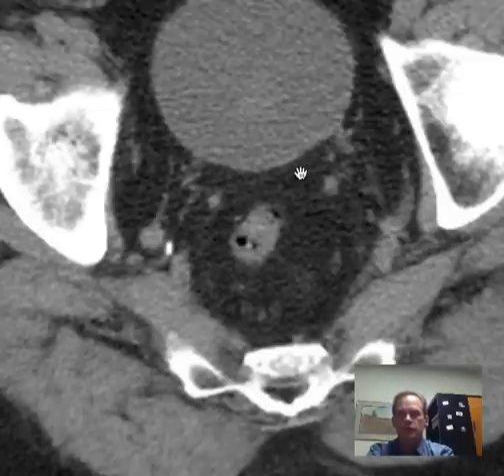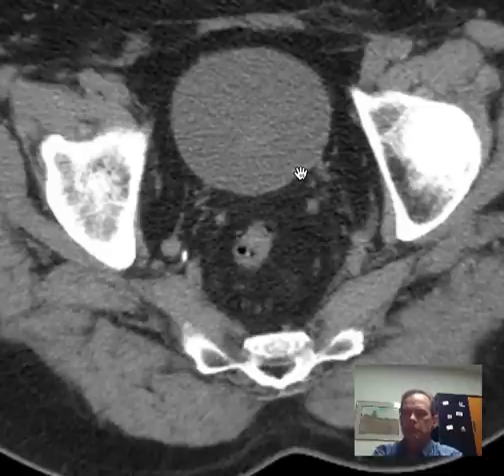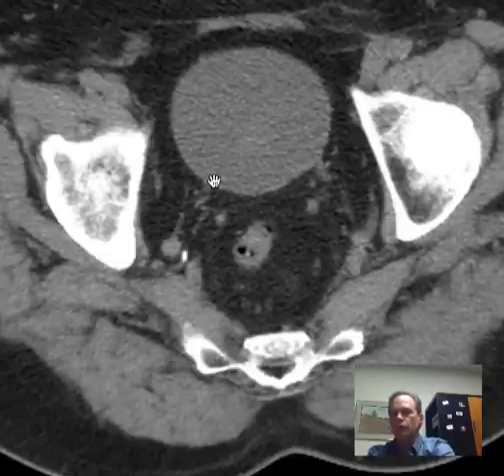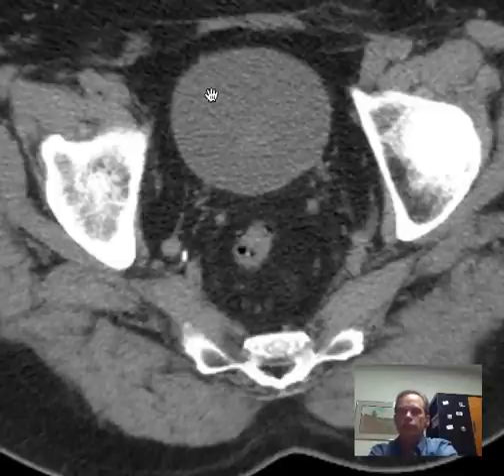We put the patients on their belly, we put them prone like this, because then if there is a calcification in the back of the bladder, maybe in the ureterovesical junction, if the patient's lying supine, it can be hard to tell whether the stone is actually lodged in the ureterovesical junction or if it's actually just lying right near it, because it can be, as you see, very hard to see the distal ureters. So we place the patient prone, and that allows the stone to fall forward.